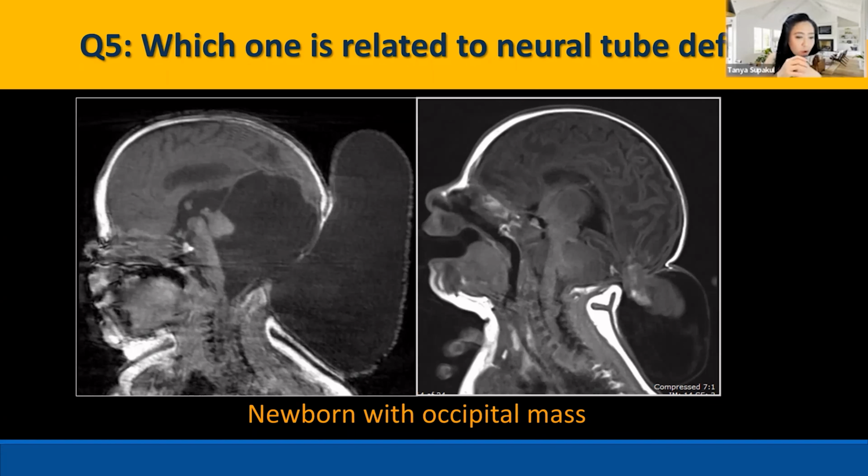The first thing, when you see something cystic or abnormal in the posterior fossa, we need to define if this is a big posterior fossa, a normal posterior fossa, or a small posterior fossa. So this would be a big posterior fossa. Yes, correct. And there is only one disease that has a big posterior fossa that we almost already talked about. That would be Dandy-Walker.